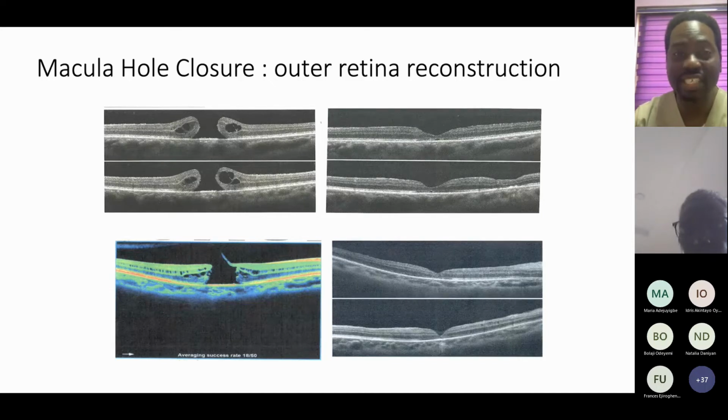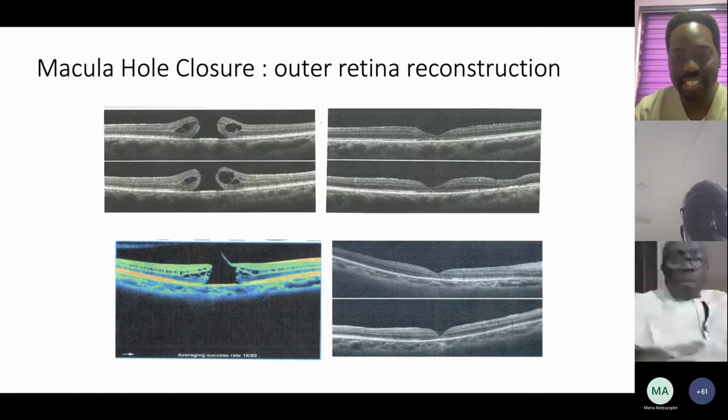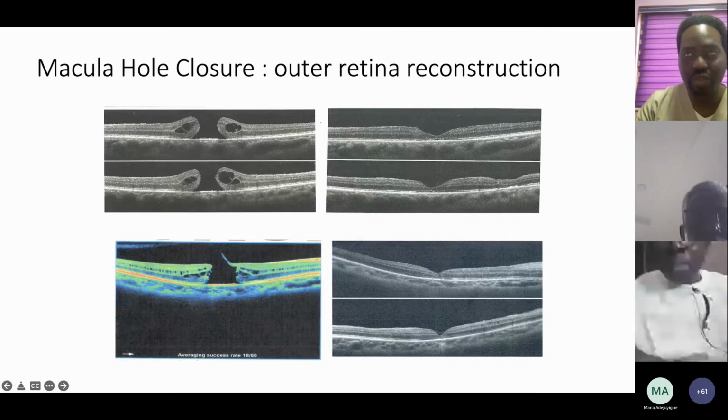The patient's vision is 6/12, and the patient says, no, I mean, something is missing. Sometimes there's something missing, but you are looking at the hole with your eye. You've done everything possible. Everything looks perfectly closed. And OCT usually tells us what is going on. And like we can see in this patient, I remember these are my patients, both of them.